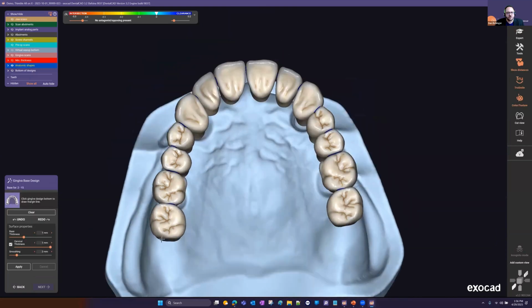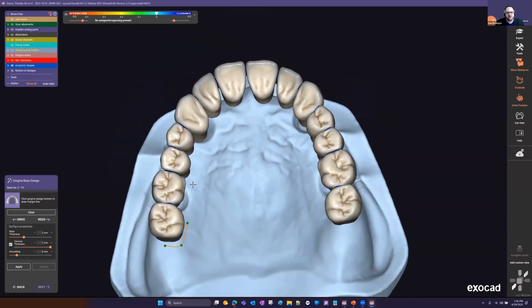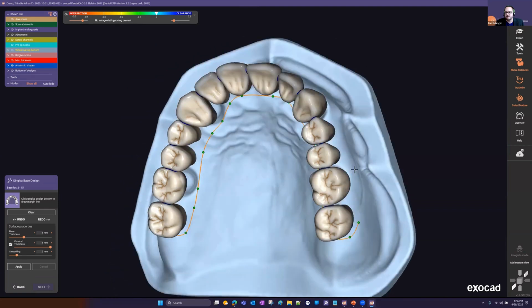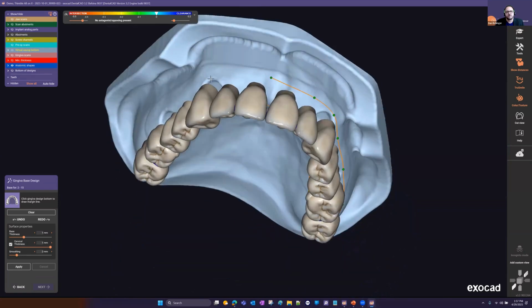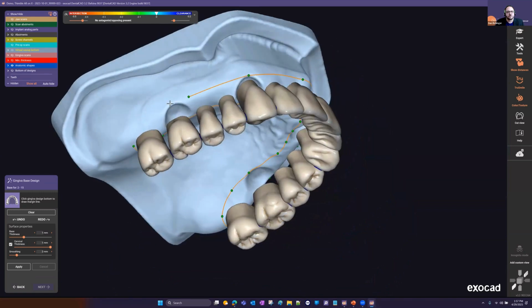All right, so we'll just add some quick points here, get the coverage we want. And double click.